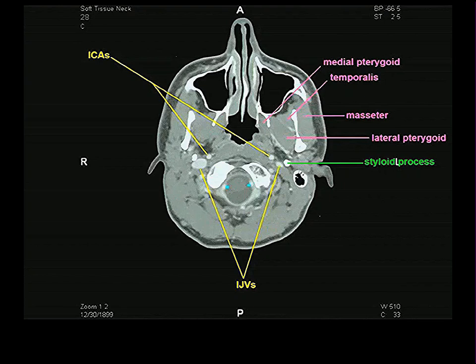I didn't know this, and I've been teaching anatomy for, 50, 60 years? I can't remember. I did not know until this summer that when you are in the erect position, your internal jugular veins are essentially collapsed. And the blood flow from your head is coming through the vertebral venous plexus primarily. Only when you are lying down, as happens with all people who have CTs and MRIs nowadays anyway, maybe in the future that will change, do these internal jugular veins fill up with blood. So they look this way because this person's lying down.